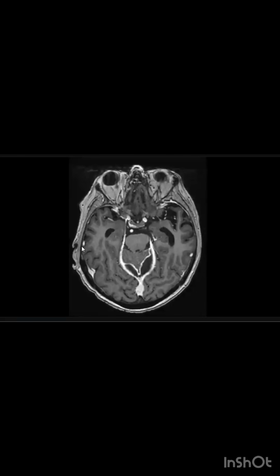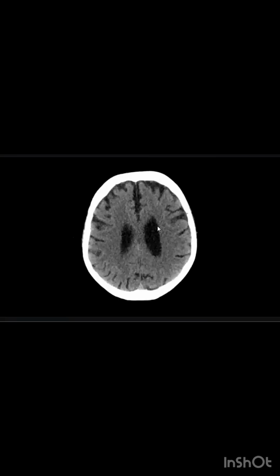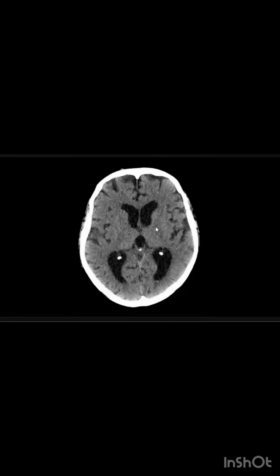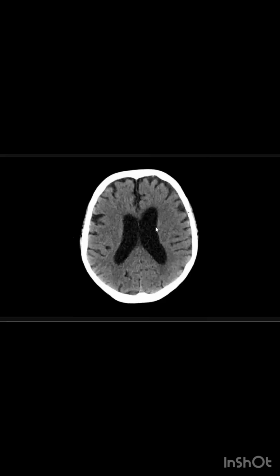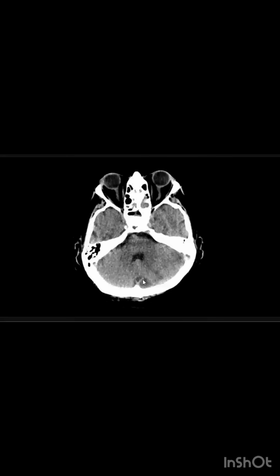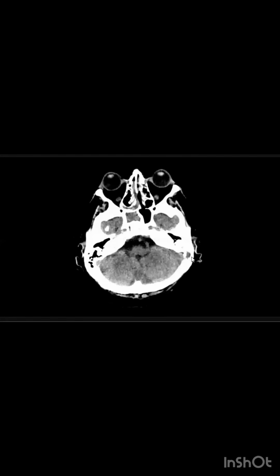Next candidate. In your case, I thought it was an easy case. Also, you have to check hidden areas. You felt some abnormality here. If you are not sure, I can see some abnormality, maybe intraaxial, maybe extraaxial, but you have to look at the mastoid air cells on both sides.